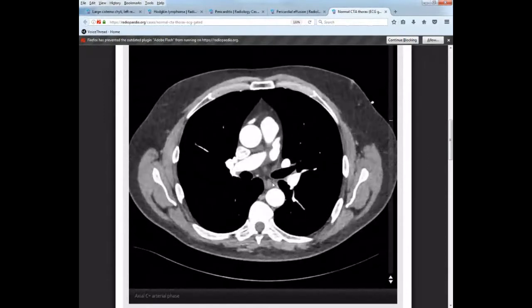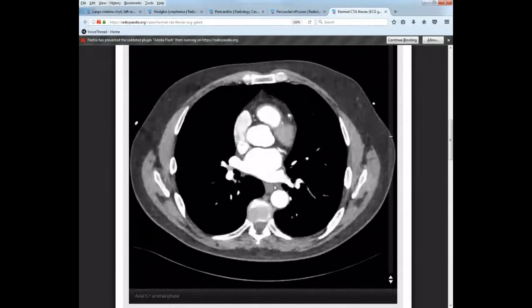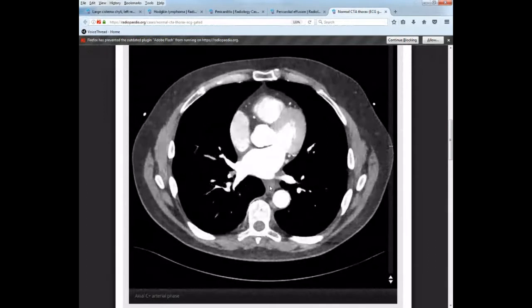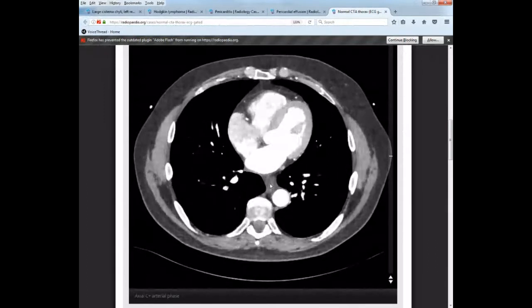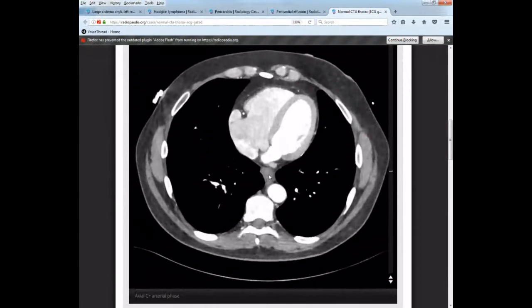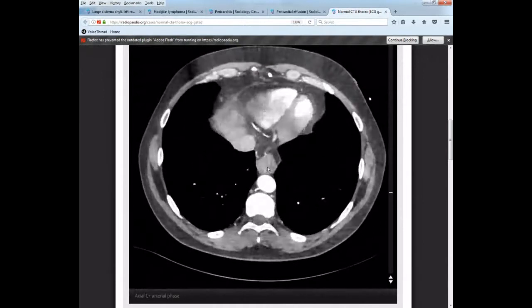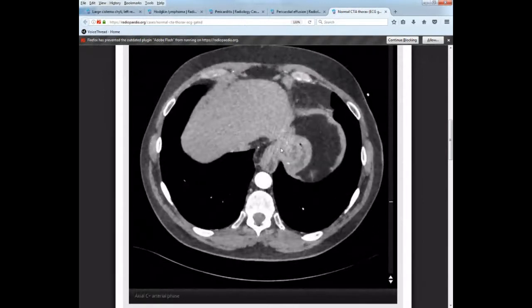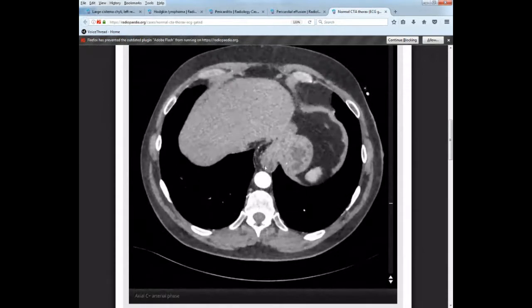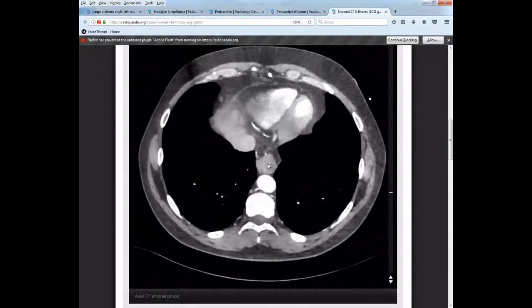Here we go. It's still here. Here it is, air in there, in that one area. It's going to take a turn to the left as it enters into the stomach, okay? Here it's going to start. It still has a little bit of air down here, okay? It's now going to go a little anterior. And here's your stomach, okay? It's your stomach right here. So here's your esophagus entering into your stomach.